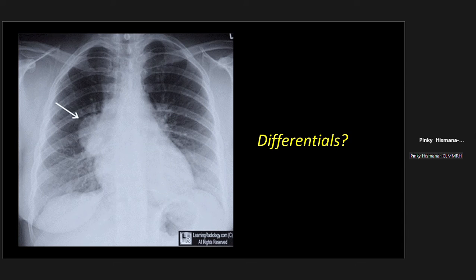That's why when we interpret X-ray images, since we are only given a frontal view, we usually use differentials. So we just say, let's say, that the primary consideration in this case is a right hilar mass, cannot rule out a vascular pathology. The reason we have differentials is that, given only a frontal view, because of the superimposition of the structures, we wouldn't know which portion it is in and what structure is involved. So when you receive X-ray results with many differentials, that leads to recommendations such as CT or MRI studies to narrow down the differentials.